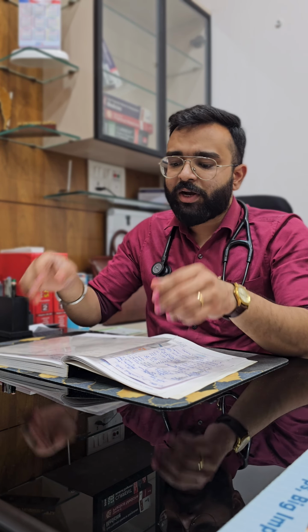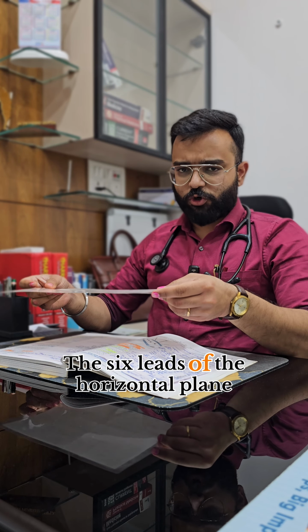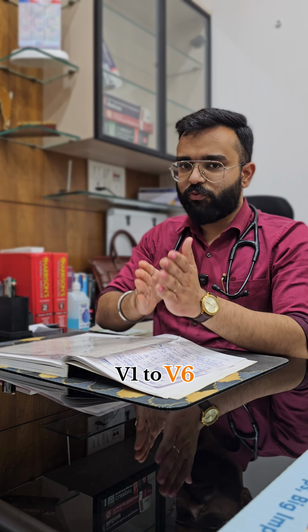There are basically 12 conventional leads in an ECG divided into 6 of the frontal plane and 6 of the horizontal plane. The 6 leads of the horizontal plane are pretty simple, numbered from V1 to V6. Let's learn the placement of these.